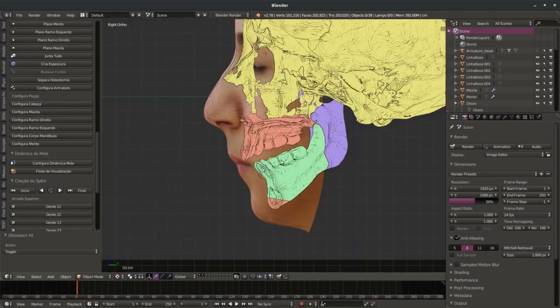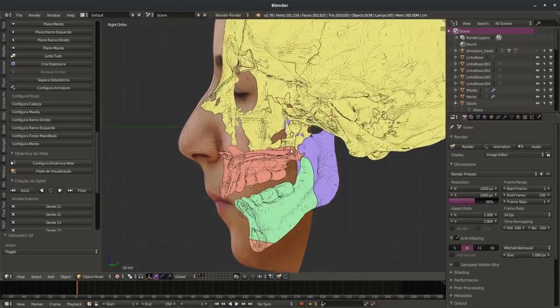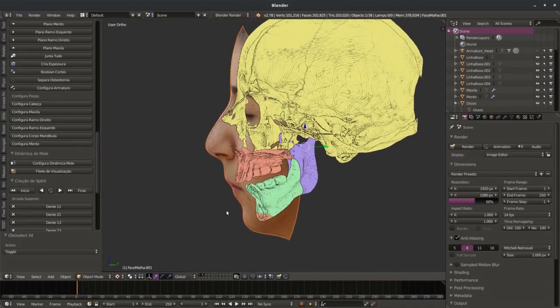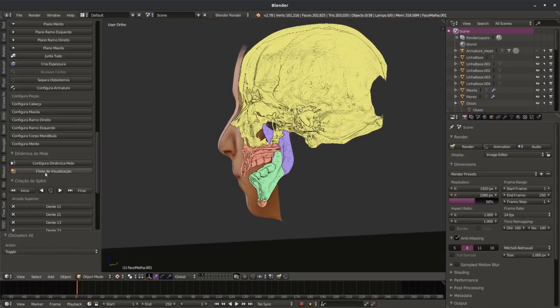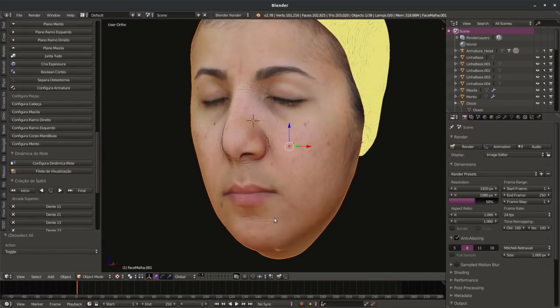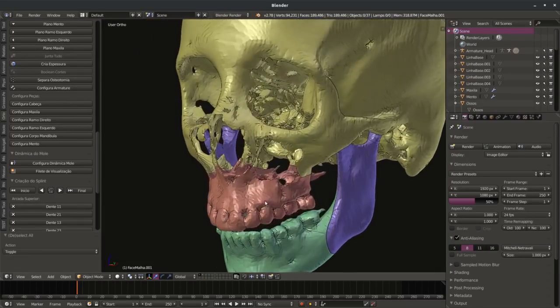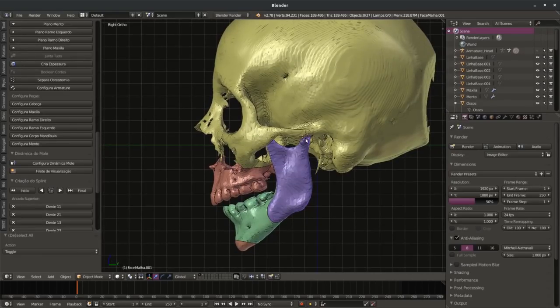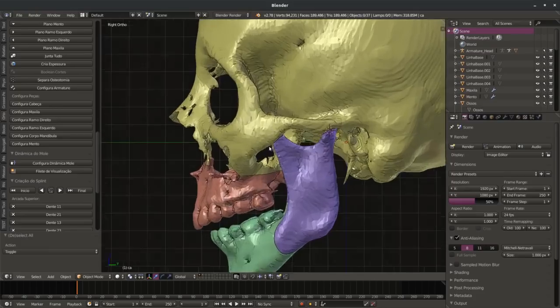Now we can animate these movements, but before animating I will click in filete de visualização again to see all objects in the scene. I will hide it, and I will keep visible only the skull to explain to you that you can record the movements you do.